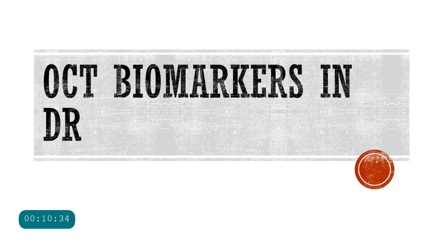Coming to the OCT biomarkers in diabetic retinopathy. These biomarkers are certain patterns or markers that you see on the OCT of a patient suffering from diabetic macular edema, which are going to predict the response to treatment and tell you exactly how the patient is going to respond to treatment, and it can help you to explain the prognosis as well to the patient.